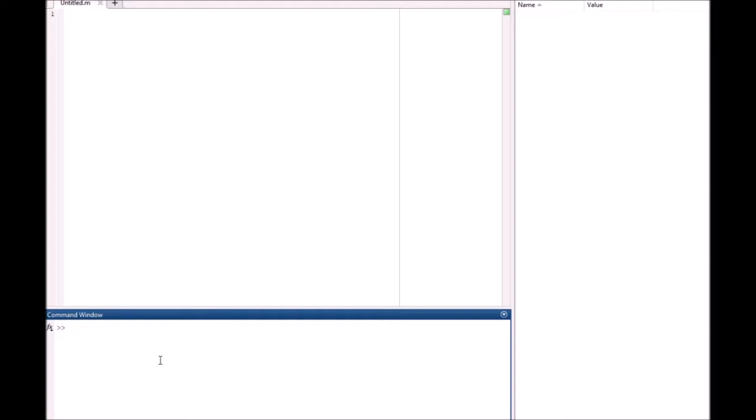I think this one is actually converted from a proprietary EKG format that's used in a hospital type setting. Basically, what I wanted to do is show you how to load up data from a .mat file if you already have it in .mat format.